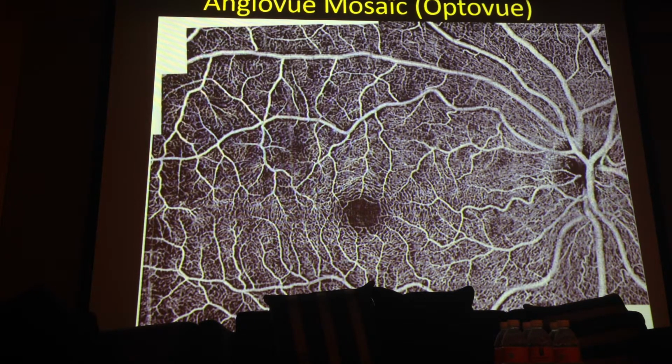The advantage of this system is we can be perpendicular to the globe in each part of the acquisition. With a long scan, with the curvature of the globe, we probably have a problem with the reconstruction of this curvature. Here we are always on the right position, on the right plane. So probably both systems will be in competition in the near future, and probably a combination of both.